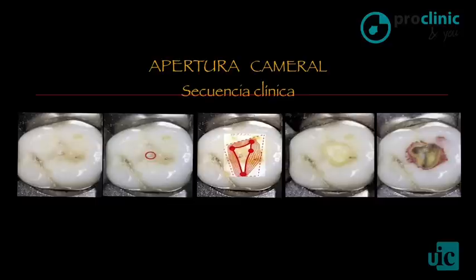We used to perform the endodontic therapy only by hand instrumentation, but nowadays we also have engine-driven instruments with continuous rotating and reciprocating movements. They help us to use a single file to conform the root canals in a safer and faster way. To top it off, the new thermoplastic techniques guarantee the success of our treatments, since they fill the root canals in a three-dimensional way.